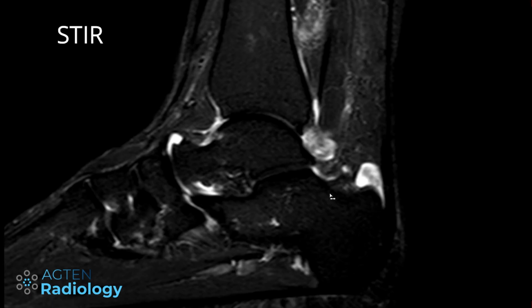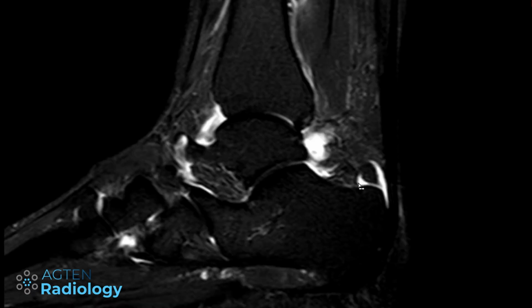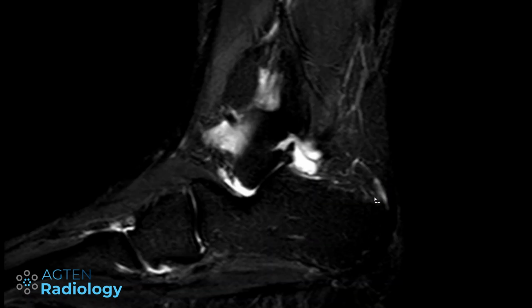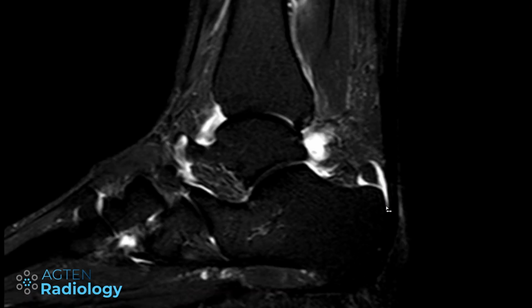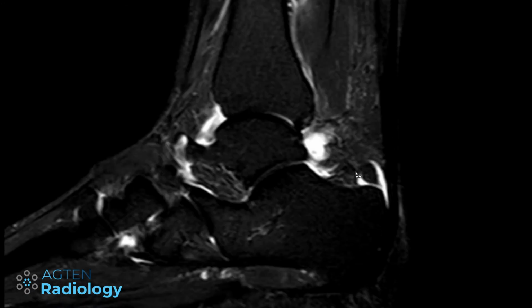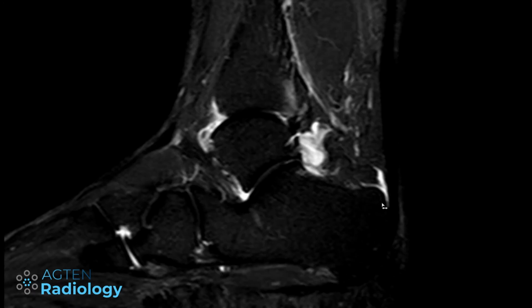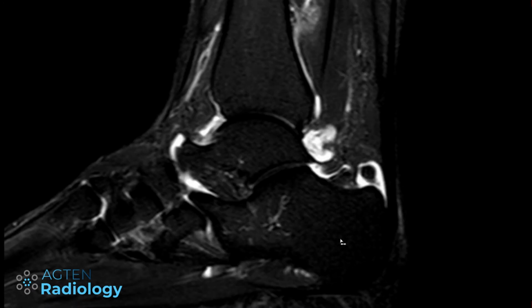Now this is another case, and you can see this time we have clearly an abnormal amount of fluid in the retrocalcaneal bursa here, and it has this funny shape with these two arms here and reaching a little bit down here, which is also normal. So it sits over this edge here and therefore making the gliding of the tendon and the fat pad over the bone here smooth. Now in this patient, this is clearly a bursitis.